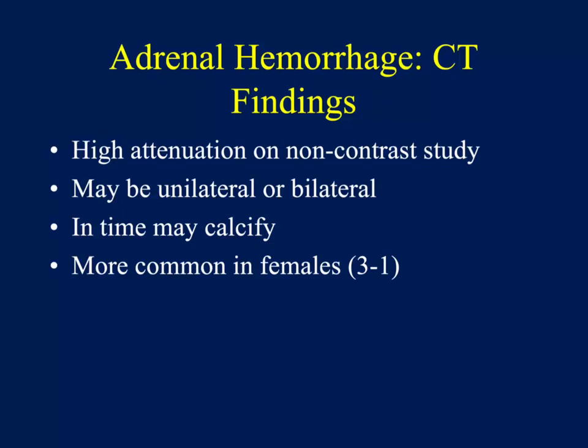Now, I mentioned hemorrhage as the reason for operating in myelolipomas. Hemorrhage can be due to many, many different causes. Typically, high CT attenuation in non-contrast studies can be unilateral or bilateral, and in time, hemorrhage will calcify.